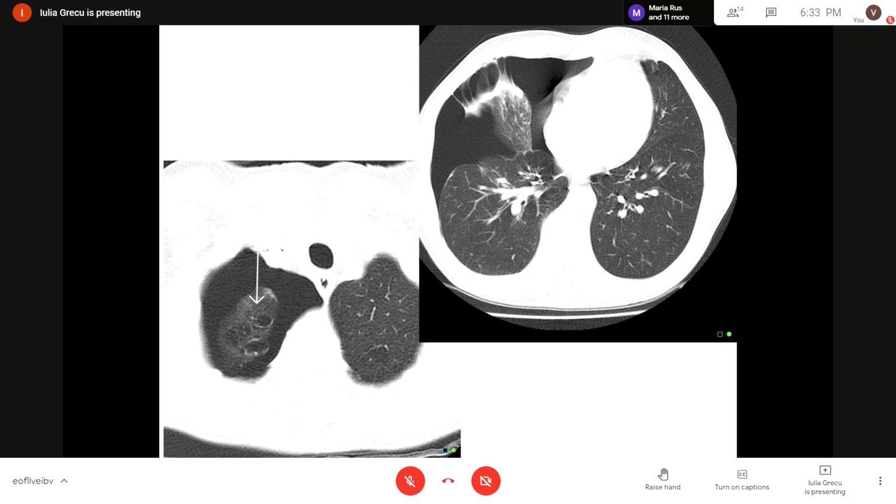And this is a chest CT viewed in a pulmonary window in which you can very nicely see the lung parenchyma. These hyperintense structures are vessels, and these thin radiolucent bands which have thin walls are bronchi, so a vessel with a corresponding bronchus. Pneumothorax, fibrotic bands, and emphysema.